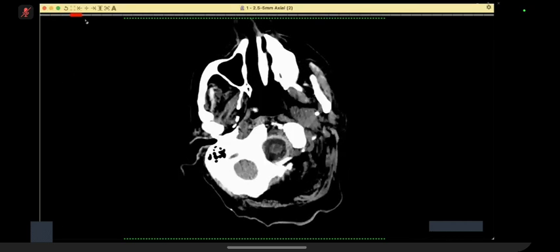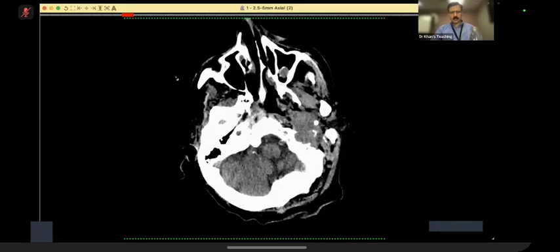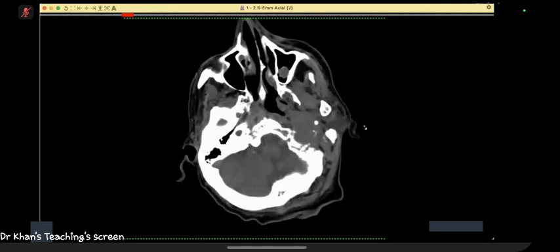This is the non-contrast CT brain, in which I can see a soft tissue destructive lesion here at the left petrous apex. I think it's in the area of the jugular foramen, which I need to confirm in the bone window further. Yes, here in the bone window, I can see there is an expansile destructive lesion associated with bone erosions and scalloping. It's epicentered in the jugular fossa.